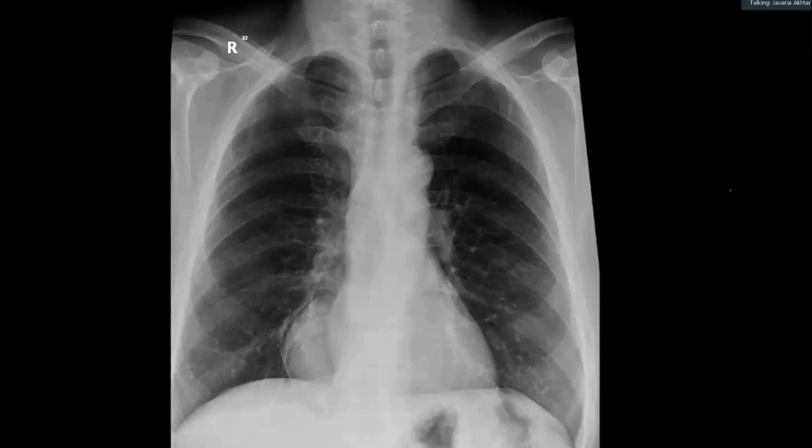This is a chest X-ray, frontal projection, of a skeletally mature patient. There is a soft tissue radio-opacity projecting over the right cardiophrenic angle. It is, however, not obscuring the right pericardiac border and the right medial aspect of the hemidiaphragm. It is not showing any calcification or cavitation.